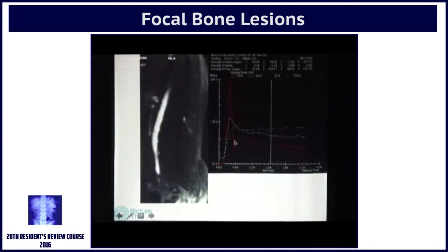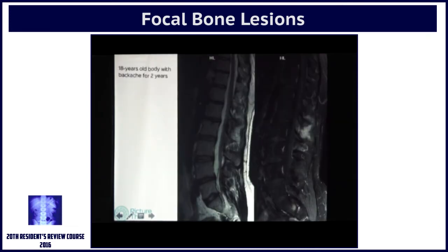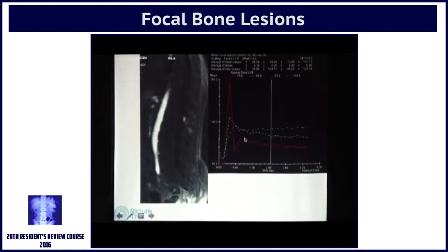Edema, always get a CT scan done. So my question is, what are you going to biopsy? This? But you don't know what it is. It's just edema. It's marrow edema and soft tissue edema. You can see that on the T2. There is no tumor. There is nothing here. What do you biopsy? Right? So you have to know what to biopsy.